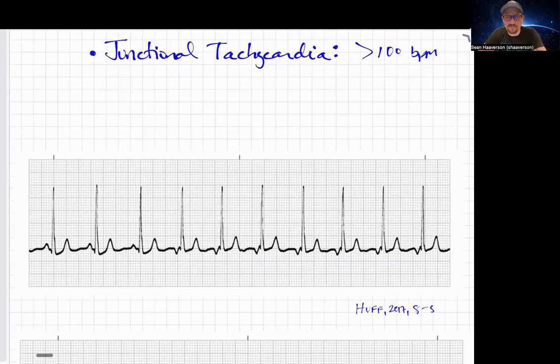All right, let's go ahead and start by interpreting a few ECGs that are all going to be junctional rhythms, but they won't necessarily be in the order that we've described there, to challenge us a little bit. Okay, so let's get started with this first rhythm, 8-5. I like to start with counting our rate to determine how fast or slow this is. We'll use the 6-second method here, although it's regular, so we could probably use the sequence method. I'm going to count 1, 2, 3, 4, 5, 6, 7, 8.5, I would call it. So that would be about a rate of 85 beats per minute. Okay, so that generally seems to be a decent rate, but we have to figure out a little bit more information before we can give it a name just yet.